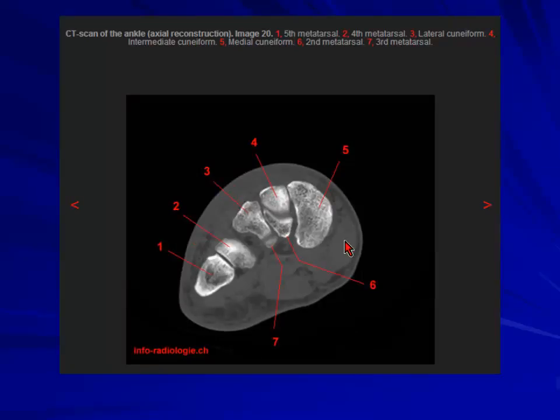If I tell you what this is, it becomes difficult. Even if you ask me, it will be very difficult. But as you go along slice by slice and looking at the proximal to distal, then you will be able to identify the anatomy. If you just give me, I'm reading what's written here. Some of the bones I know, but some of them which are appearing is difficult because it's one slice after the other and it's not in continuum.